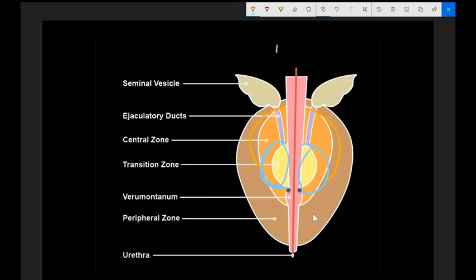If you go to the axial vignette, it'll give you the zonal abbreviations for a lot of these areas, and I do my zone mapping or descriptors in my dictation almost always off the axial projection. We also have the seminal vesicles, which are secretory glands that contain proteinaceous fluid. Although they may be desiccated, they vary in their signal intensity. We've got the ejaculatory ducts or ductus deferens, and then two other important structures.